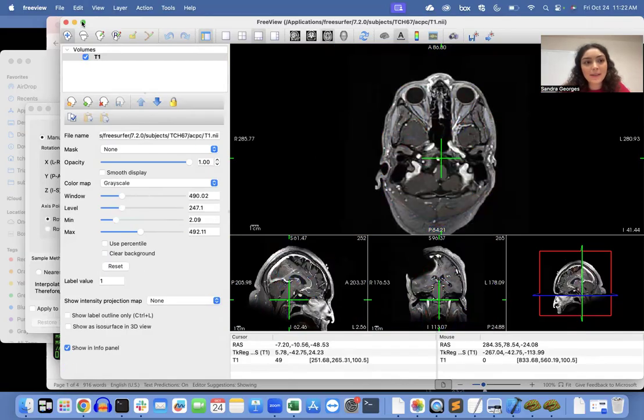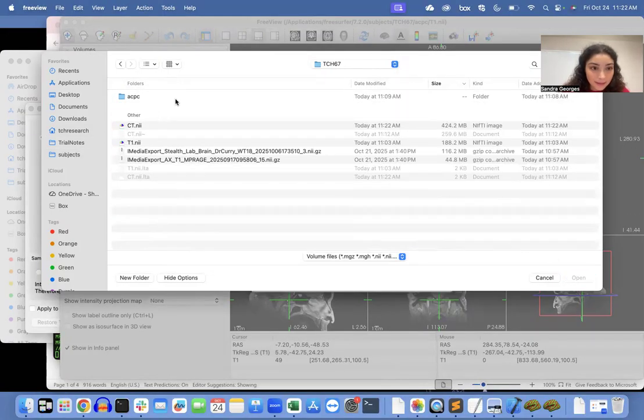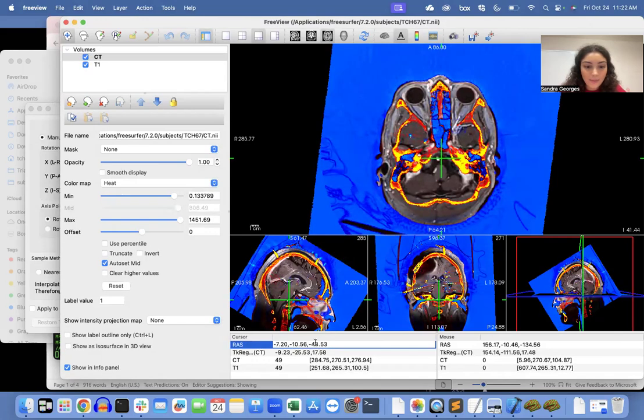Okay, so I'm going to exit out of the CT again. It's just saved out. Reopen it one last time, make sure it looks absolutely perfect, and then we should be good to go with our coding. So, saved as CT, and now we should reopen it with the same coordinates.